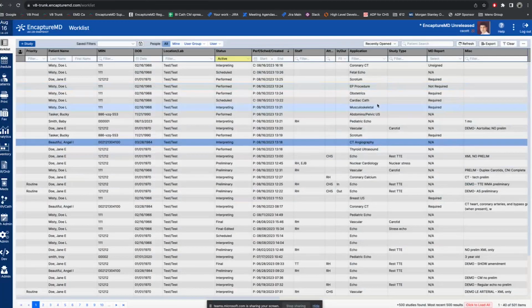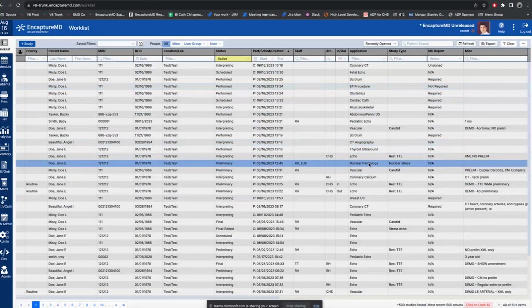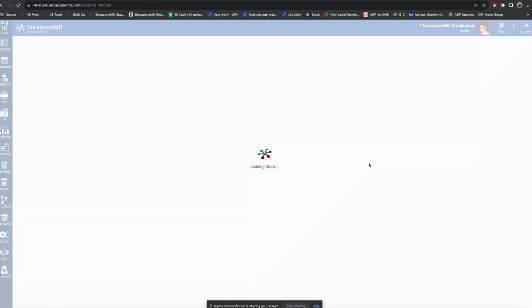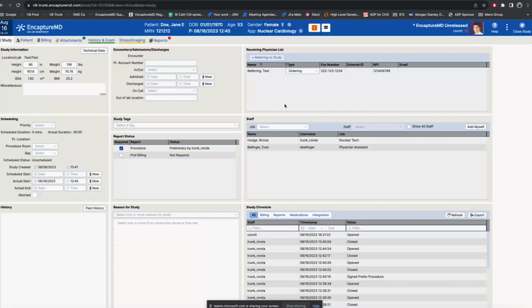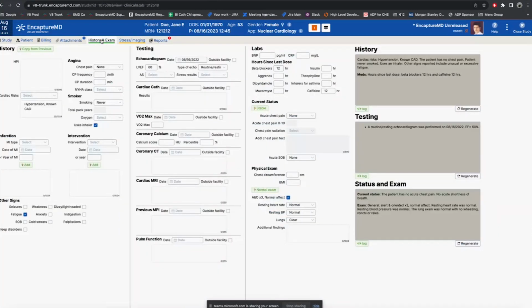So the other things I wanted to show are, let's look at nuclear cardiology. So this is nuclear stress and MUGA scans. MUGA scans have sort of fallen out of favor for changes in left ventricular function with chemotherapy, for example, but it's still available. And by this point, you've been looking at our applications, you can see there's commonality, right?